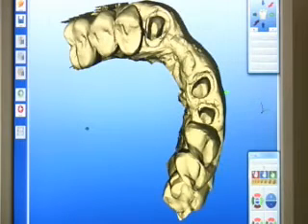To design the provisional, it will ask you in the opening screen what will be an abutment and what will be a pontic. It will then direct you on where to marginate or place your pontic tissue surface. In this case, we start with number 6, we marginate, and then it will ask for the pontic site for number 7, pontic site for number 8, margin number 9, and margin number 10.